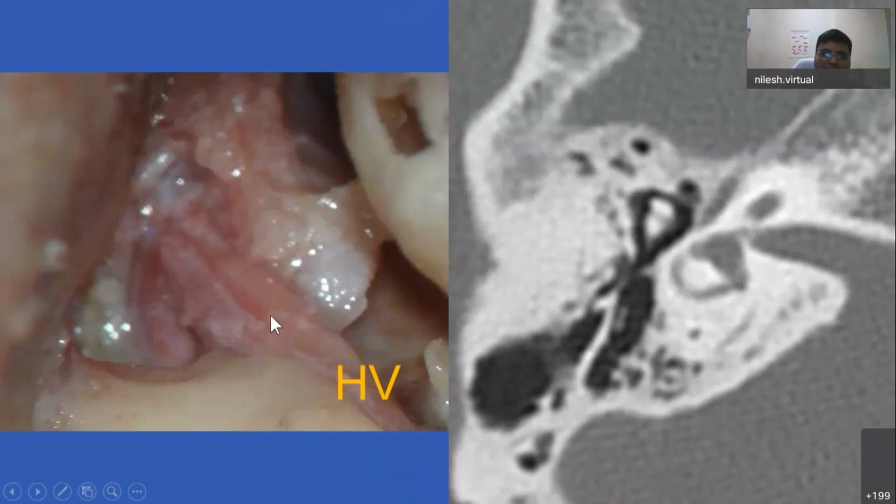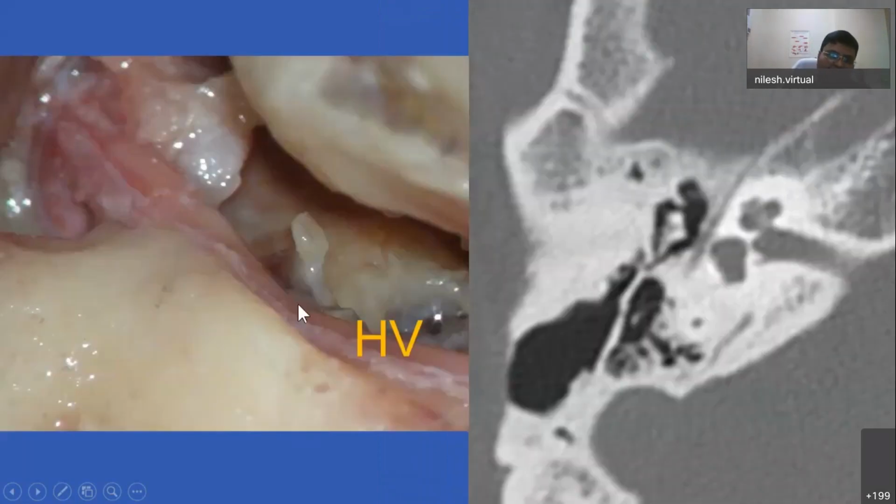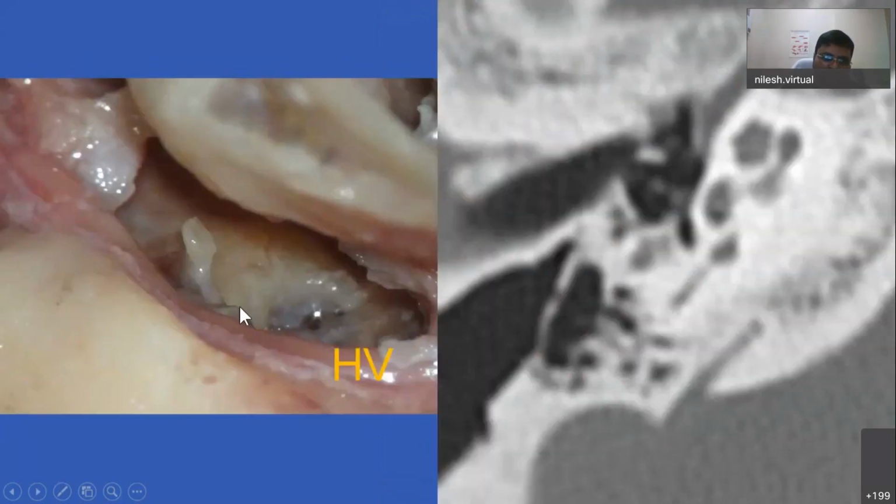The bulge in the facial nerve is nothing but the geniculate ganglion. So you can see here the bulge in the facial nerve. It is the geniculate ganglion. Still come further down. This is the horizontal segment of the facial nerve. Still come further down, posterolateral to the pyramid. So this is the pyramid. Posterolateral to the pyramid will be the second genu, where the facial nerve becomes vertical.